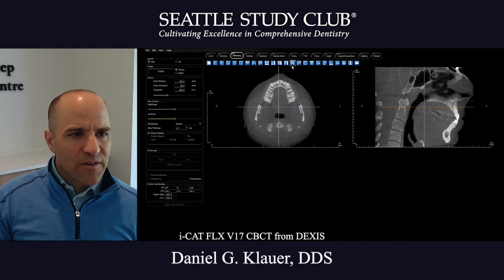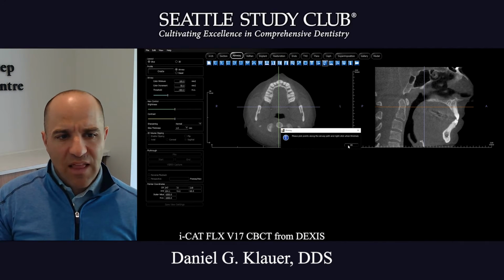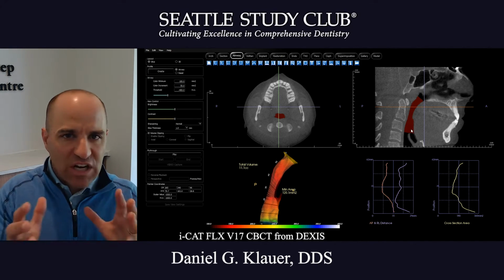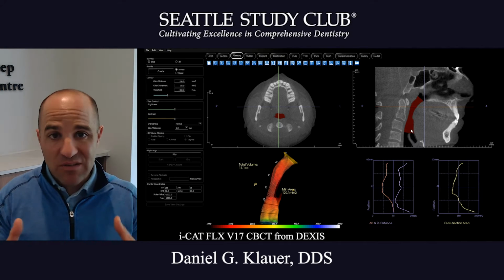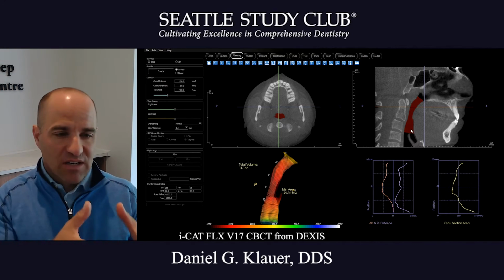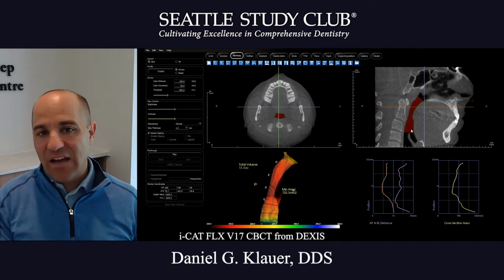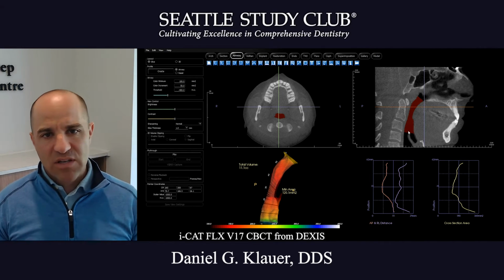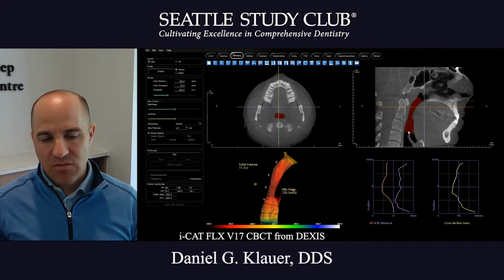We do look at the airway function. To be honest, I don't talk a lot about it with the patient as it's an upright, awake position, so it is what it is. It could change based on the position the patient is in. But I can tell a patient, look, in this position, it's likely not going to get better at nighttime. So we will comment on it, but I usually don't hang my hat on that for any sort of diagnosis.